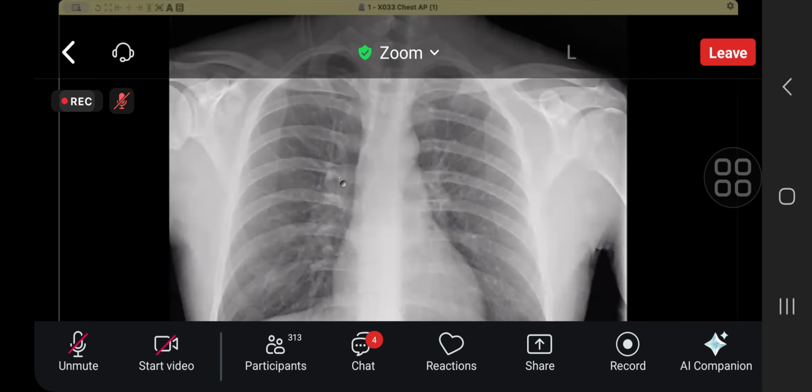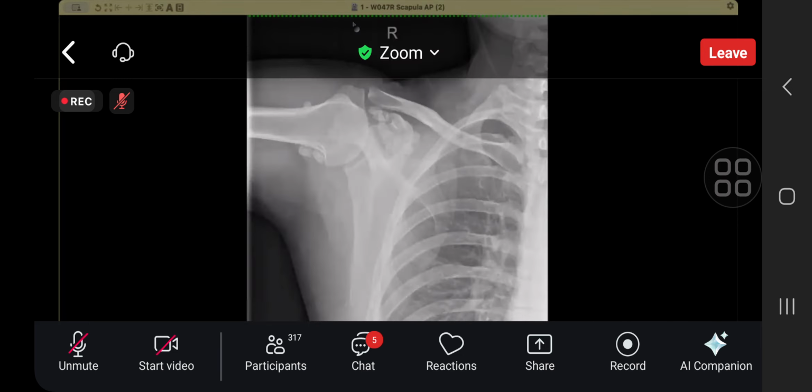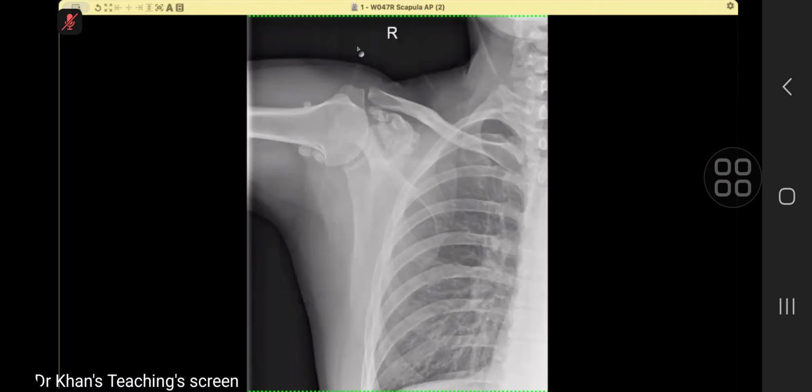So it was a classical incidental finding. You can see these projecting over the scapula, which was well picked up by the candidate ultimately. And then ask for the simplest next test, which is a common sense test. Ask for an X-ray, which will confirm the diagnosis.